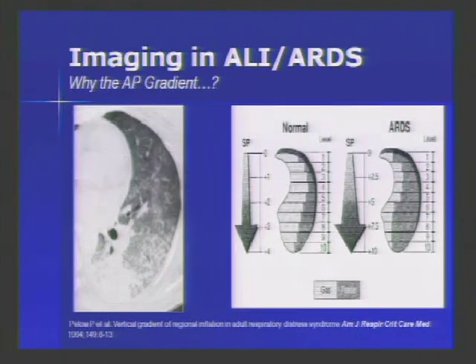Now, I've talked about this gradient from front to back. You might imagine that because this lung is wet, we're simply looking at the gravitational effect of gravity on the distribution of edema. And that makes sense, it's intuitive. However, again, CT analyses have shown that in fact the wet lung in ARDS simply behaves like a sponge. And so the pressure as we go down from the ventral lung to the dorsal lung increases progressively. And so the lung, behaving like a sponge, actually pushes down on these lung units, and these lung units, rather than representing more edema, simply represent areas of atelectatic lung.